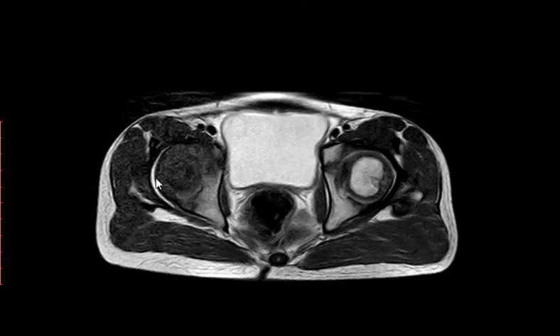Avascular necrosis of the femoral head. Avascular necrosis of the capital femoral epiphysis. Yes. At this age, you don't say femoral head because the growth plate is still open. When it's closed, you say femoral head. So the capital femoral epiphysis, avascular necrosis. Okay? What is it called? This disease has a name.